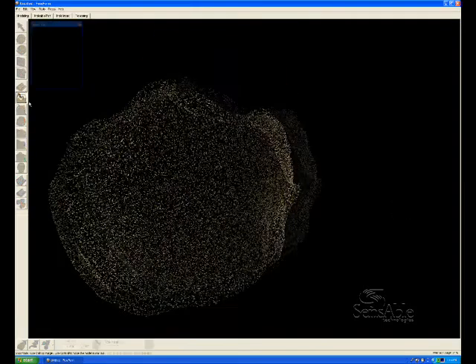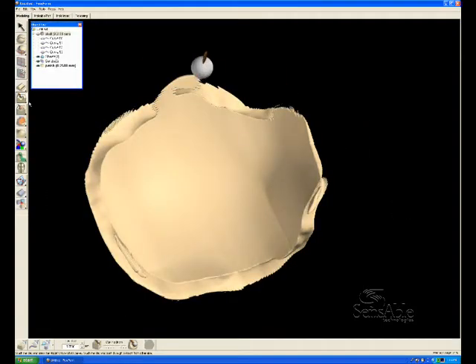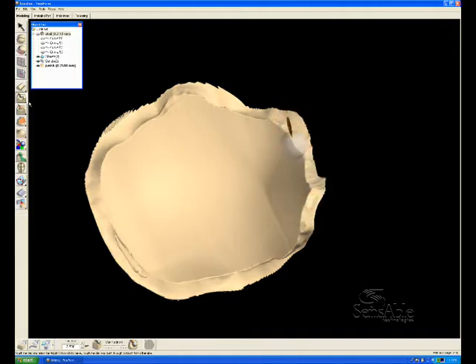We've created a perfect juncture between the defect area and the geometry of the patch, but everywhere that hung inside the skull has created these undercuts. So we don't want to have undercuts, especially if this is going to be cast or manufactured in a traditional two-part mold. We simply don't want undercuts at all. Also, for the implant procedure in the operating room, there can't be undercuts, obviously. So we carve those away.